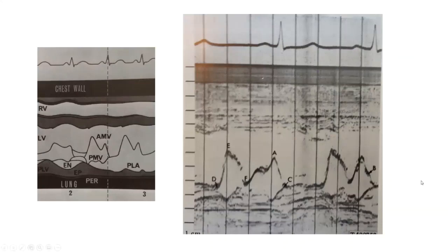Let's zero in a little bit more on the mitral valve envelope now. So here in schematic form is mitral valve envelope. This is a strip chart recording of a mitral valve from many years ago, and we don't record this way with the mitral valve anymore. And these time points in the mitral valve envelope are given conventional names, which I don't think you'll be tested on.